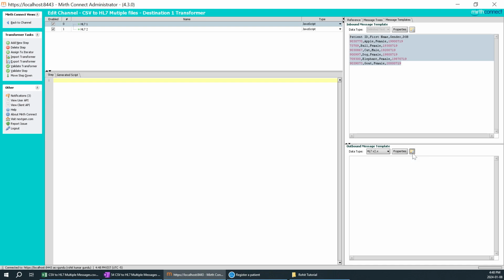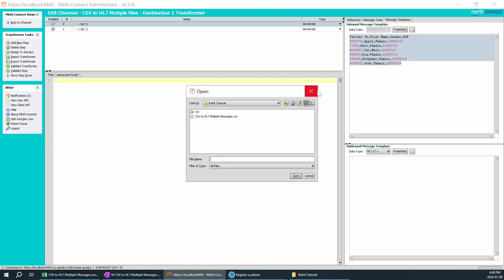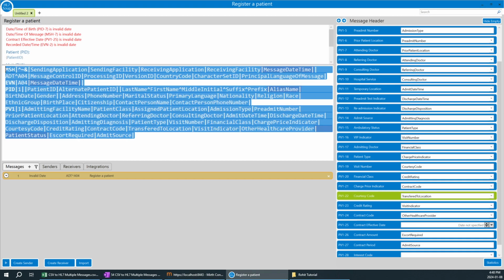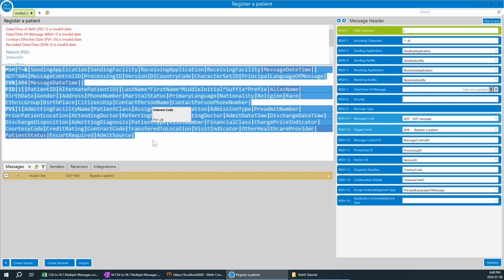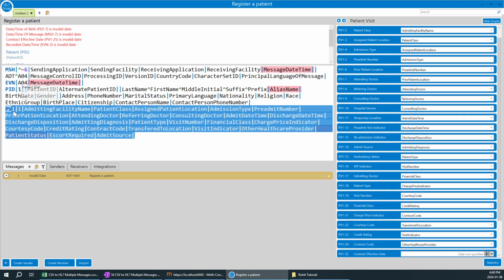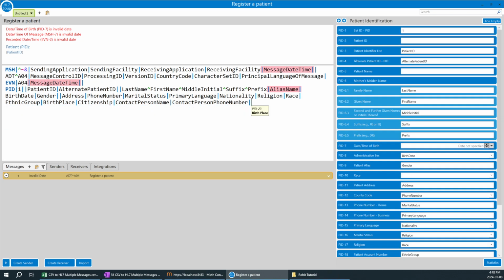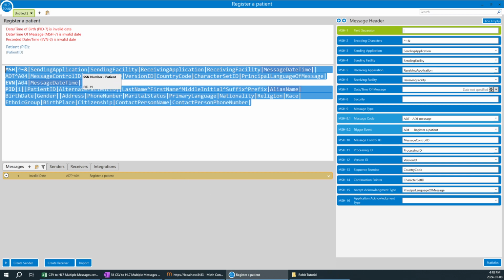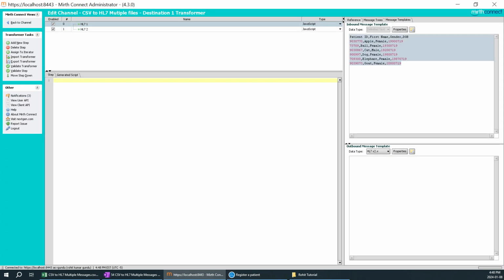Now I'll click over here, and I need an HL7 message which I am trying to convert. So I'll copy this sample message. For our understanding, I only want the PID segment, so I'll remove everything apart from the PID segment. This is one of the sample messages which I created for better understanding. I just kept some random text, as we shouldn't show production data or any other test data as of now. Perfect. I'll copy it. You might be thinking, is it valid?